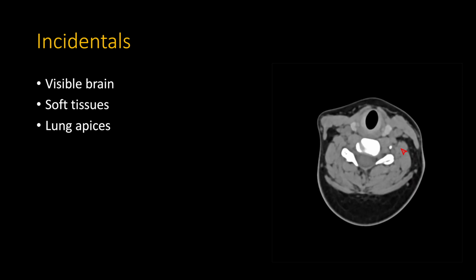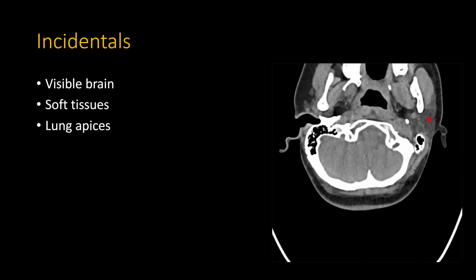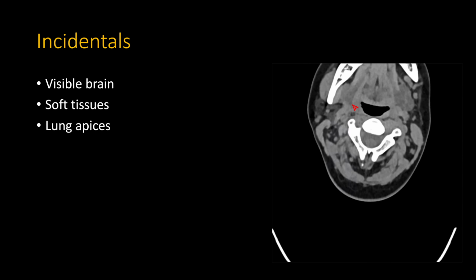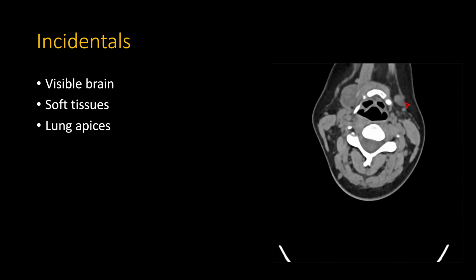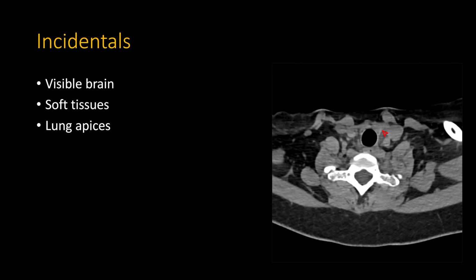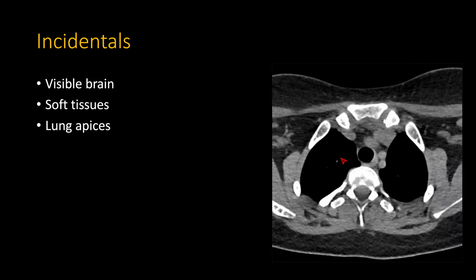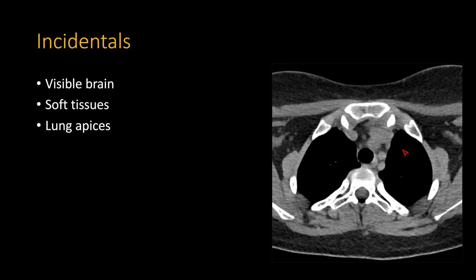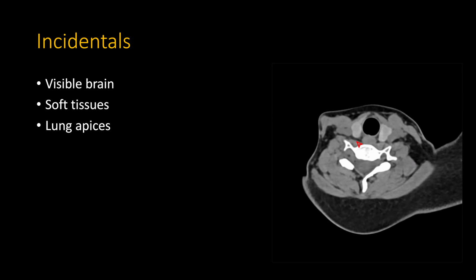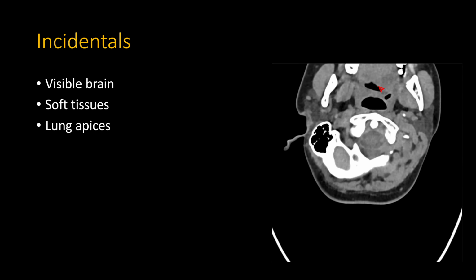More straightforwardly, I typically make sure I look at the salivary glands or the parotid glands on either side. So parotid gland here on the left, parotid gland here on the right, the submandibular glands on either side here and there. Go down and look at the thyroid and make sure that's okay. Very common to find little thyroid nodules, etc. As I'm coming up, I look at the major lymph nodes, here, supraclavicular, cervical level 5, coming up your jugular chain lymph nodes, and make sure there's no lymphadenopathy.